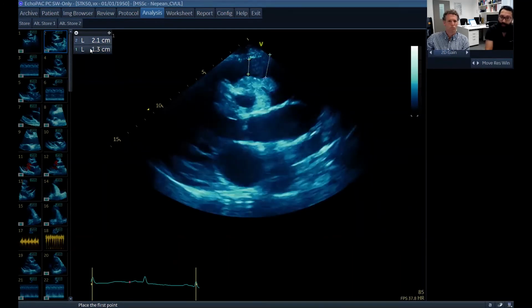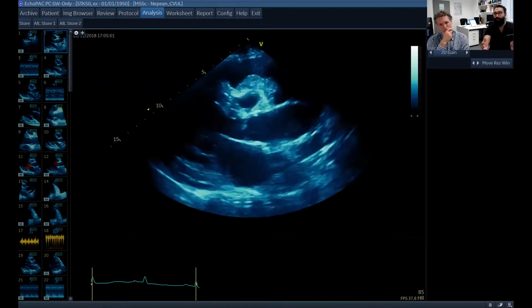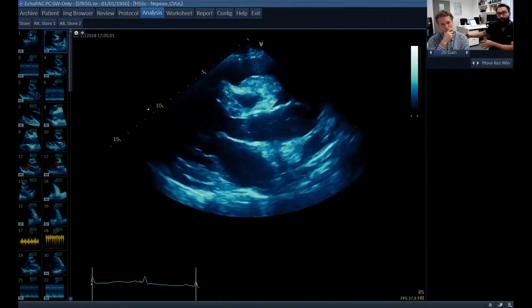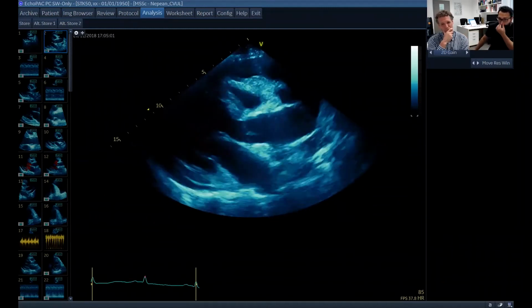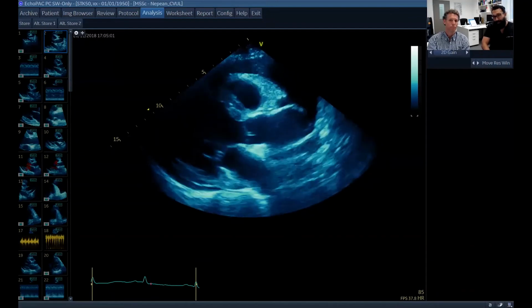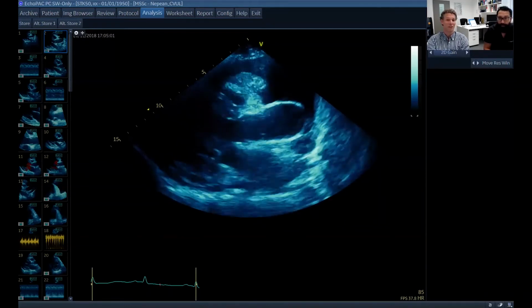But even in a parasternal long axis view, you've got to look at supporting features to suggest how bad this tamponade is. Probably the only interesting factor here is that the heart rate is 85. So in someone who was about to crash, really compensating on tamponade, I would expect a tachycardia. So that's something that doesn't fit with our entire picture. But a large effusion, what looks like an adherent mass, which personally I think may just be a fat pad, but it could be a malignant mass as well. It could be infiltrating. You can see sarcoid cases, which also have deposits such as this. So I think you have to have an open mind and proceed cautiously. Yeah, and maybe I should say that at this stage, you know, we've.